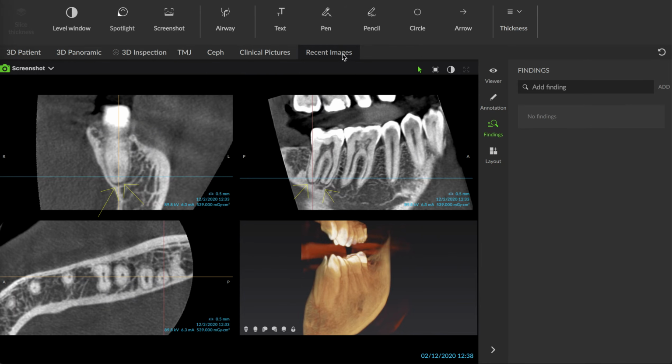And so we did the same thing that I'm trying to do with all my patients, is grab screen grabs to point out, yep, here's your infection right there. There's your infection right there. One thing I would improve on this image is, the blue line is actually this axial slice. I would have moved that, scrolled through here before screenshotting, so potentially we could see some of that PDL widening here that we're not seeing in this image.